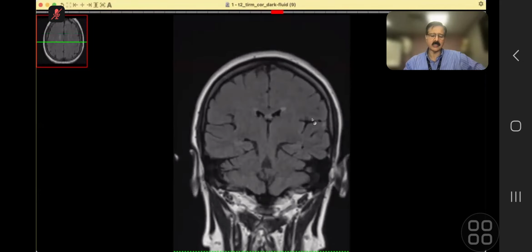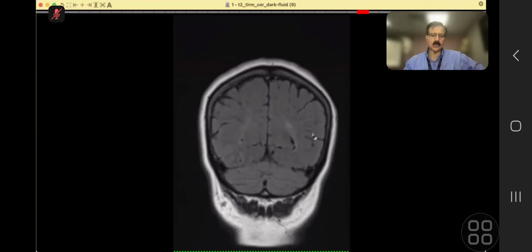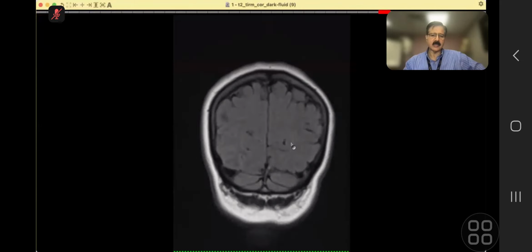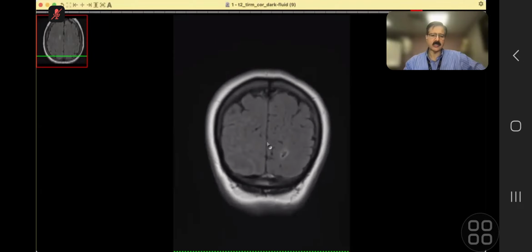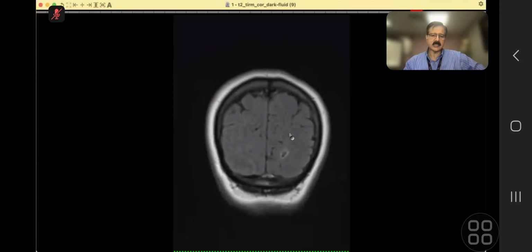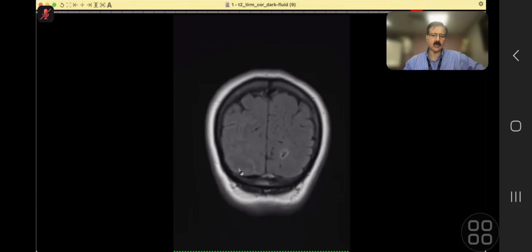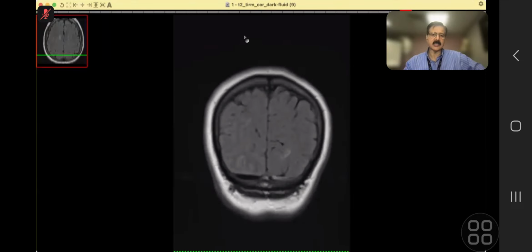If you are very casual, this also tells you your reflexes, how you look at the coronal FLAIR, and this is just the periventricular region. As we go more distally, look at the sulci and compare it, and then you can convince yourself that something is happening. All of these sulci are high signal.